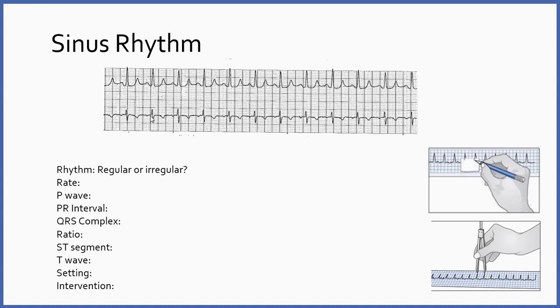It's just that they're essentially from different angles. If you walk around a person, they're going to look different depending on the angle that you see them. For our purposes, pick the view that's easiest for you to find the parts and pieces. So let's apply the algorithm you just learned to figure out what's going on with the strip.